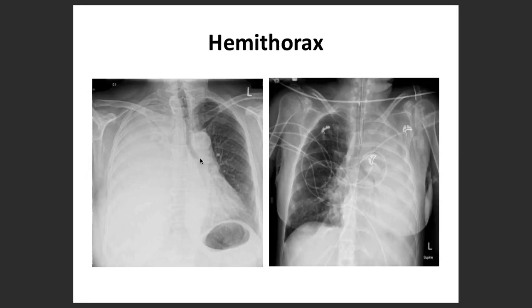So what are those three types? It is going to be pushed away from the opacification. For example, this is the first type. This could be a pleural effusion, if there is a large lung mass, or otherwise if there is a diaphragmatic hernia as well. That is where it is going to be pushed away.